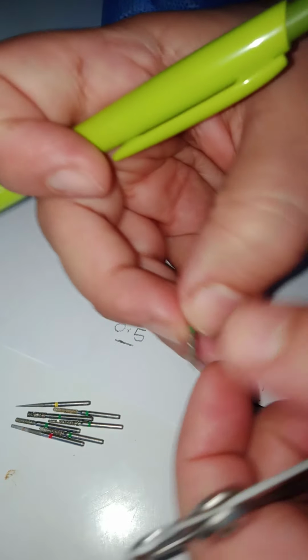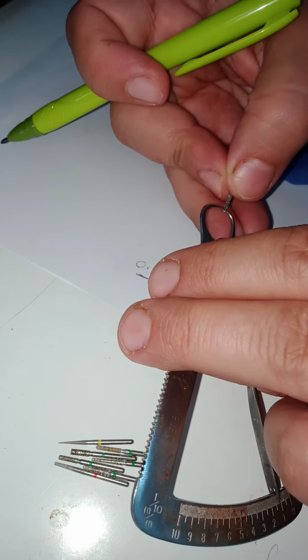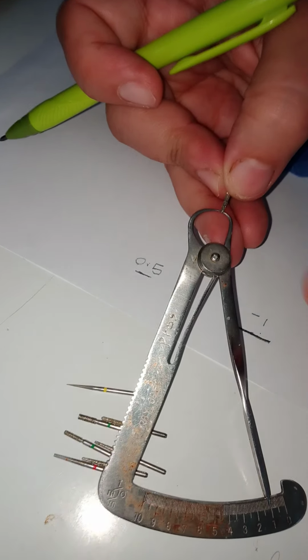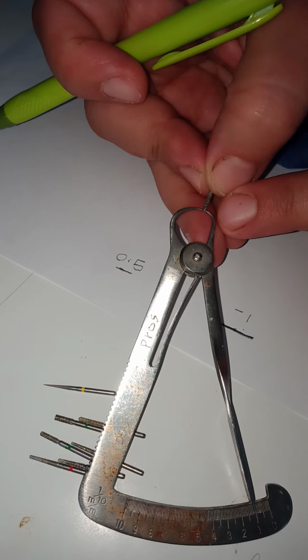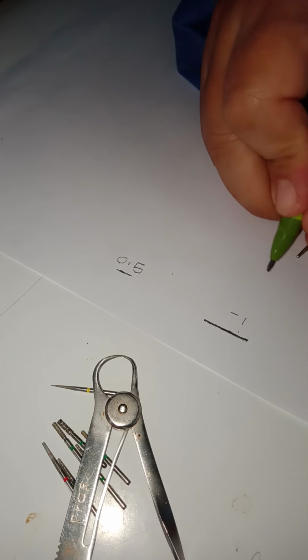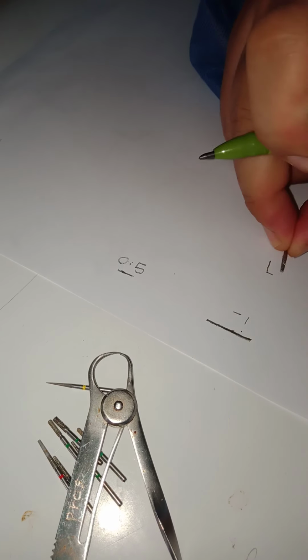So I always ask my students to gauge the bur. This is the crown gauge. The tip of it is around how much? It's 1 millimeter. So if I prepare with this bur, it goes into the tooth. That means if I create a shoulder with this bur, I'm not magnifying the shoulder, I'm making it minimum.